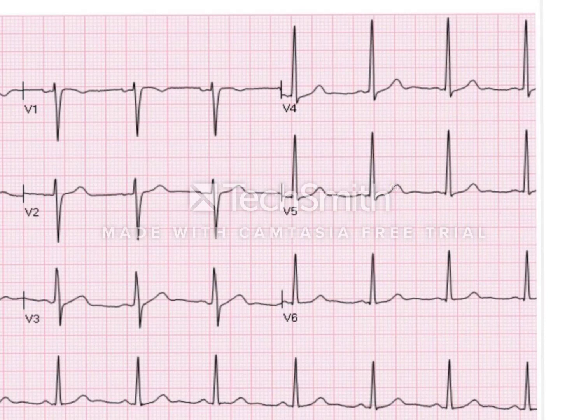And for hypertrophy, you're going to look specifically at V1 and V6. You're going to look for large R waves in V6 or large S waves in V1 to suggest left ventricular hypertrophy. So large R waves in V6 are going to suggest left-sided forces because V6 is pointed out and to the left, versus negative forces in V1 are going to be more leftward as well. Tall forces in V1 suggest RVH, and then negative forces in V6 are going away from the left and therefore RVH. So for LVH, we'll use red.